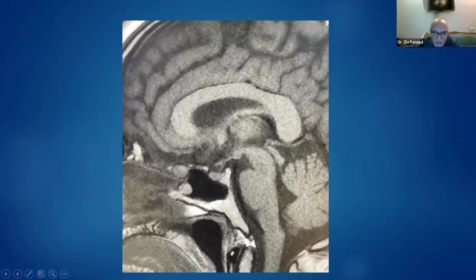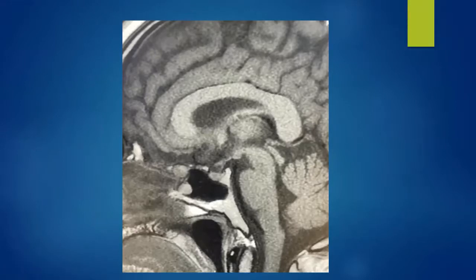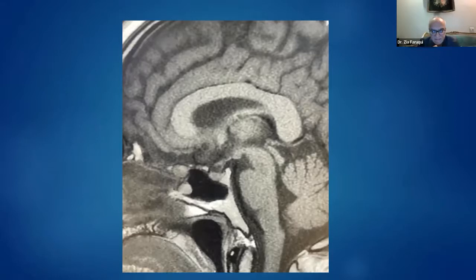Okay, look at the pituitary gland. This patient has, I'll give you the history. This patient has excessive urination. कहते हैं जी मैं सारा वक्त पेशाब करता है. I think they should try to recall the normal anatomy on T1. जी बिल्कुल. Right. This is the hint.